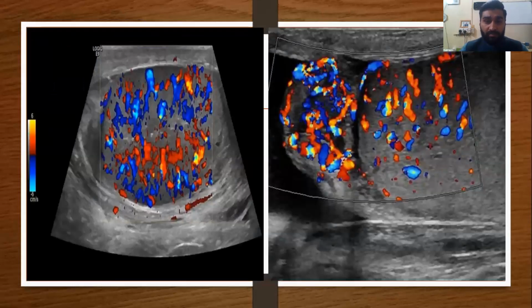Here comes the orchitis on the left of the image. Well, the testis, inflammation of the testis, and the role of Doppler in diagnosing the orchitis. It's very important when you use Doppler. Without Doppler, it is almost incomplete to diagnose orchitis or epididymo-orchitis. So if we put a color Doppler on testes, there will be increased blood flow throughout the testicular parenchyma, representing active inflammation. Similarly, image on the right, the epididymis is swollen, enlarged, along with the testes with some reactive hydrocele, representing an epididymo-orchitis.